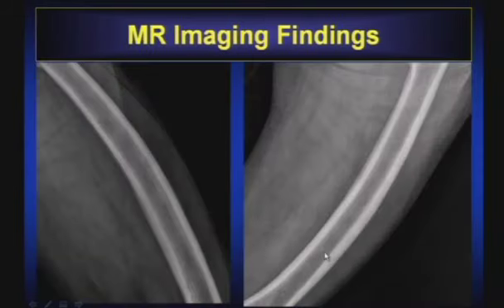Here's another example of how subtle these things are. So here's the plain film. This was a person who was on bisphosphonate therapy chronically, had femur pain, got femur films. Okay, what do you think? Hard pressed to say a whole lot, right? But we are alerted to the fact that we're looking at the lateral cortex, and we're alerted to the fact now that we think that endosteal changes may predominate initially. So kind of subtle, but look at that.